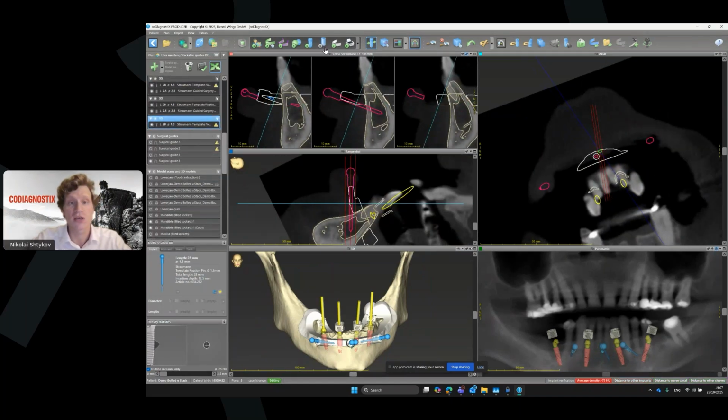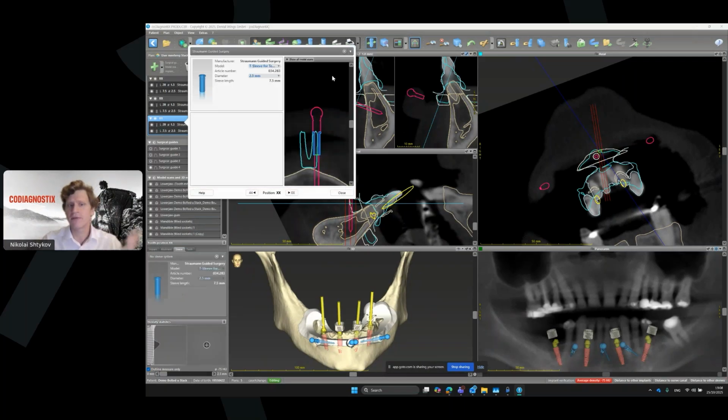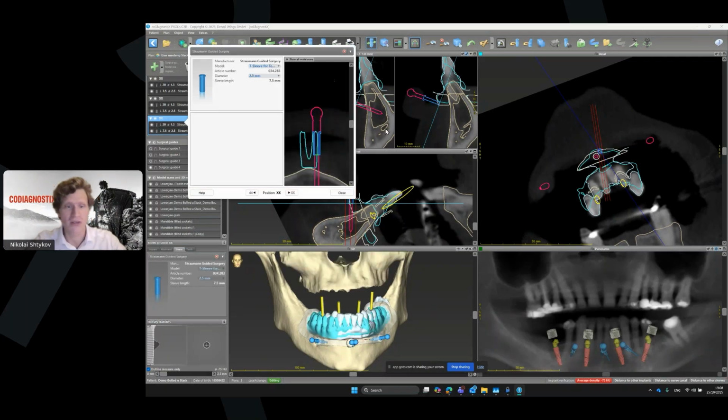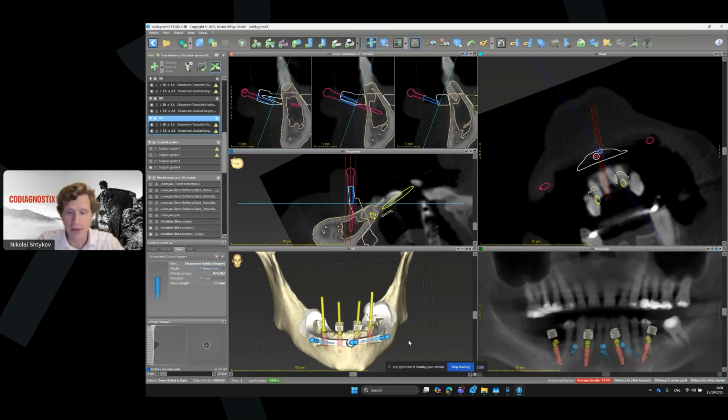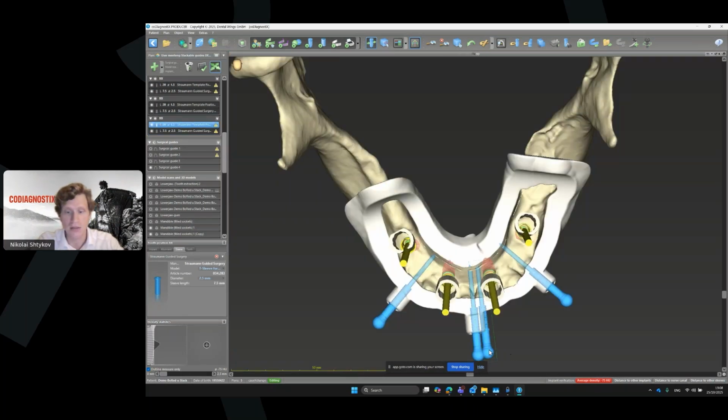You can do this in step 6 in my sequence, or here, for example, sleeve. You select it, and here everything is intuitive. You don't need to make any other selection. Just click on close, and that's it. Right now, you can see that the pin is in place. I will remove this one last because we don't need it here.